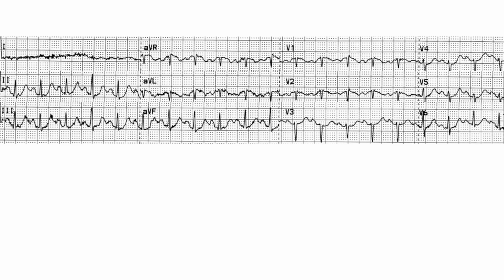So when I looked at it, I thought this could be COPD. Another hint for me for COPD, the QRS in all leads is just not large. It doesn't fulfill the criteria for low voltage, but in those precordial leads, you do fulfill the criteria for low voltage. So the idea of low voltage in some sets of leads suggested to me this could be COPD, not just an MI. Although with MI, you can have low voltage.